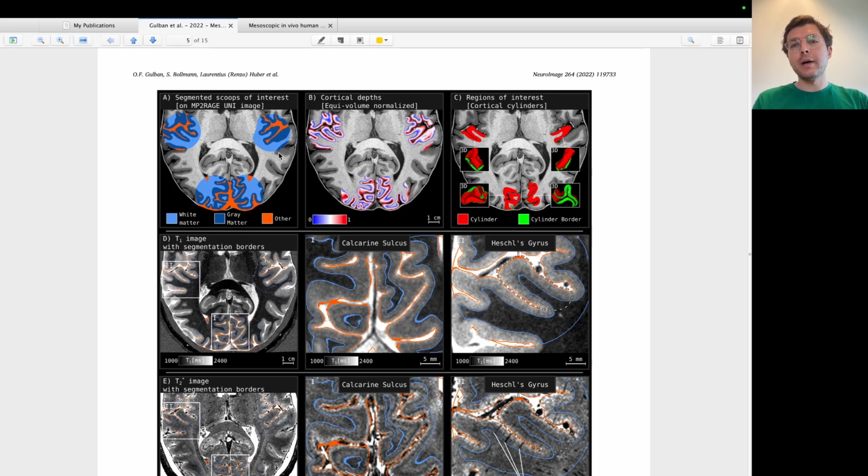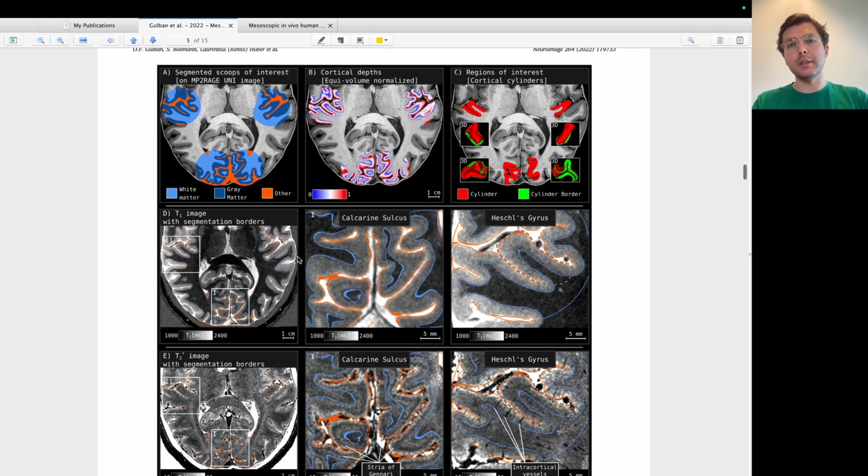And because this was very high resolution data at 0.35 millimeter isotropic, analyzing this data at double resolution, which is upsampled twice, which makes it nominally 0.175 millimeter isotropic, can be a bit heavy for personal laptops and maybe slightly older computers. Therefore, it is more beneficial if you just crop the regions that you don't care about in this data set. You can see that here, I don't even have the frontal cortex reported in the figures.